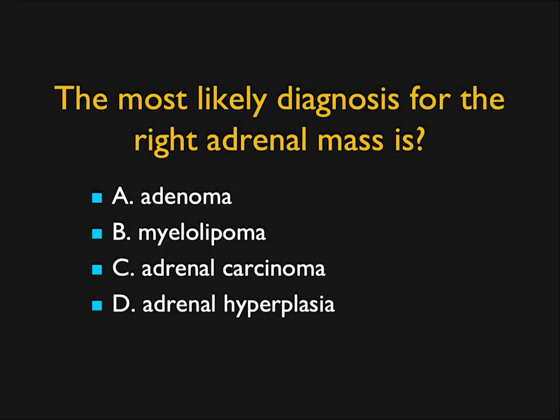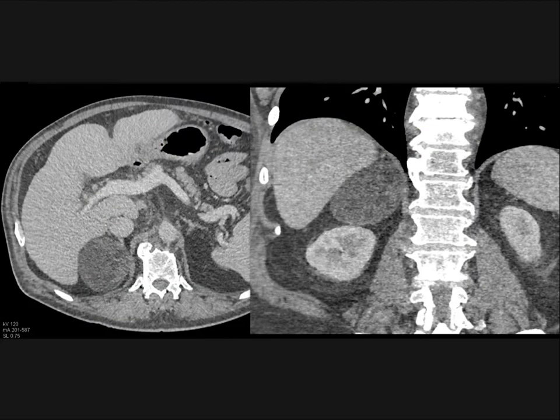This is a simple case, and today I was at Adrenal conference, which is why I showed this case. It wasn't one of the cases from conference, but we always see people get very excited about these lesions, and they kind of want to work the patient up. If you look at the lesion, it's low density. In fact, you put a cursor, it's minus 30. You look at it compared to the retroperitoneal fat, which is typically minus 80. This is a fatty lesion.